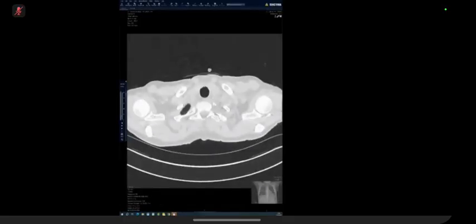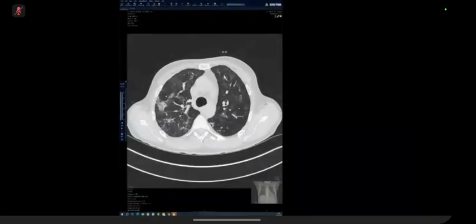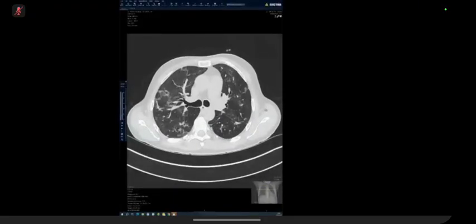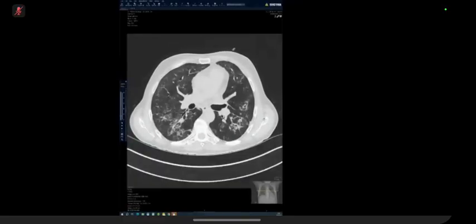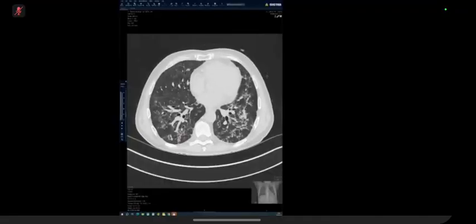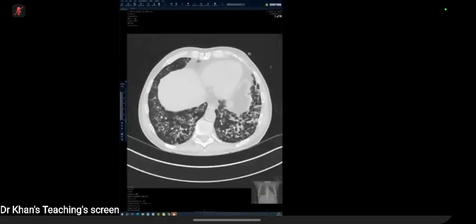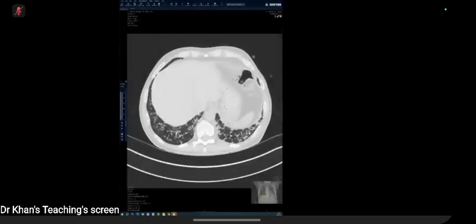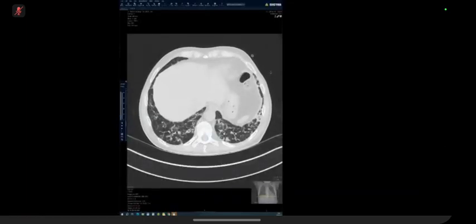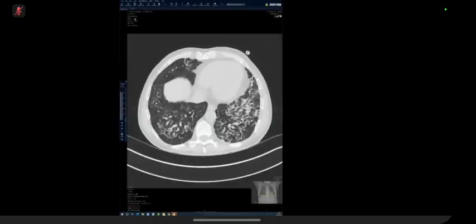Thank you so much. In these cuts of the CT, I can see that the pattern here is keeping with consolidation surrounded with ground glass opacities. So this keeps with halo sign, but not too peripheral. So this can keep with organizing pneumonia.